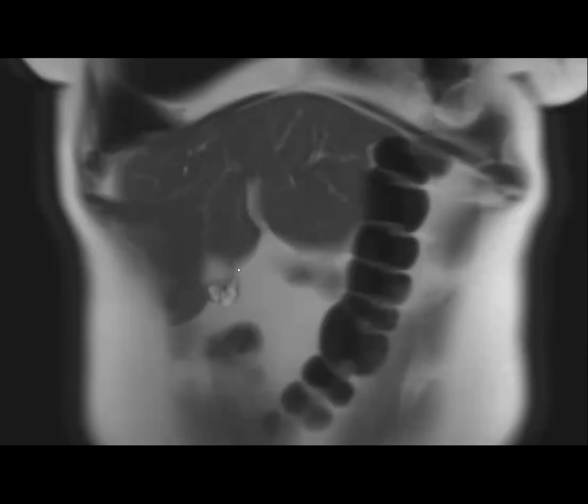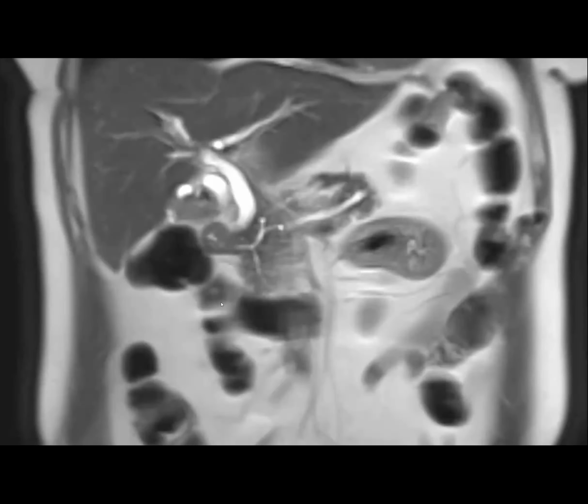As well as fundal adenomyomatosis. That's what I would have said here. This is classic fundal gallbladder adenomyomatosis with these cystic spaces, which are like the cholesterol and glands and the Rokitansky-Aschoff sinuses. And then maybe even there's a segmental hourglass gallbladder, where a ring of adenomyomatosis is causing two different channels with stasis of bile in the fundus of the gallbladder.